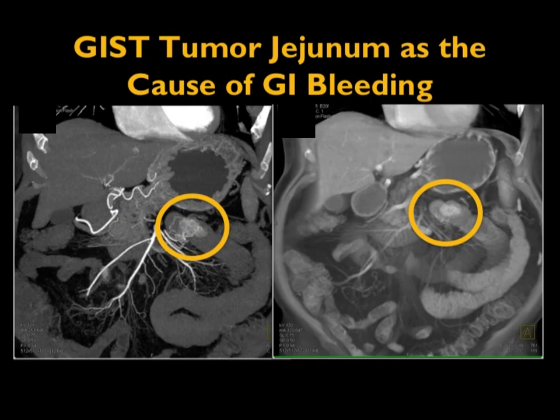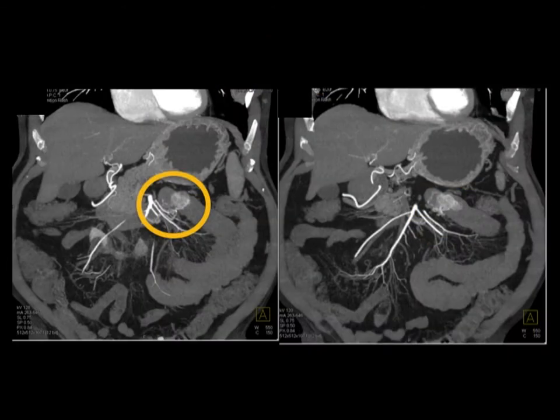We talk about small bowel tumors, and we are commonly seeing now small GIST tumors. Interestingly, large GIST tumors tend not to bleed. It's the small ones that are very vascular. The larger ones are relatively hypovascular. Beautiful example here. You could also consider a carcinoid tumor, or, if the patient had renal cell carcinoma, metastasis to bowel. But typically, these are these GIST tumors, very, very vascular.